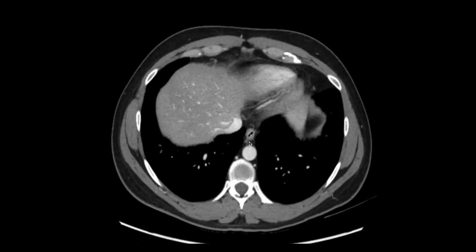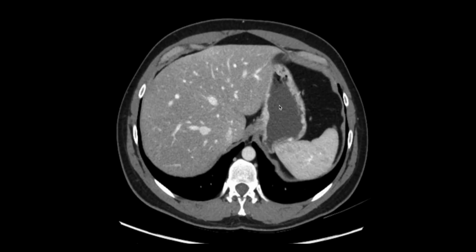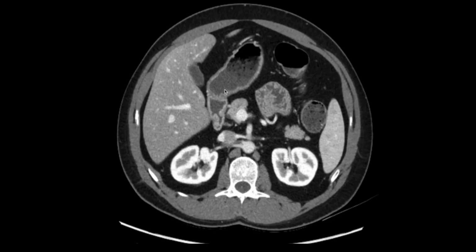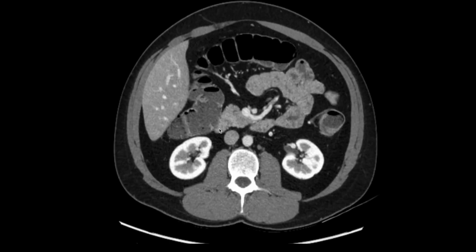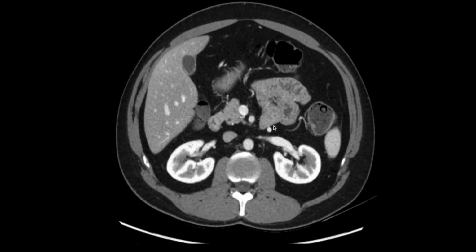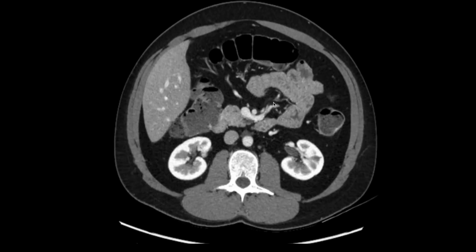Running the upper GI tract, I start with the distal esophagus, gastroesophageal junction, stomach, pylorus, duodenal bulb, and second portion of the duodenum, heading down into the third portion, which crosses midline, to the ligament of Treitz and the proximal jejunum.